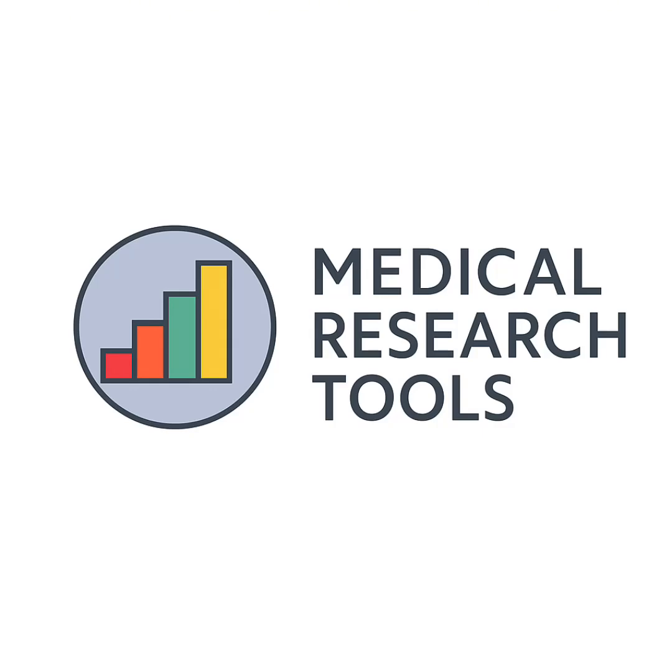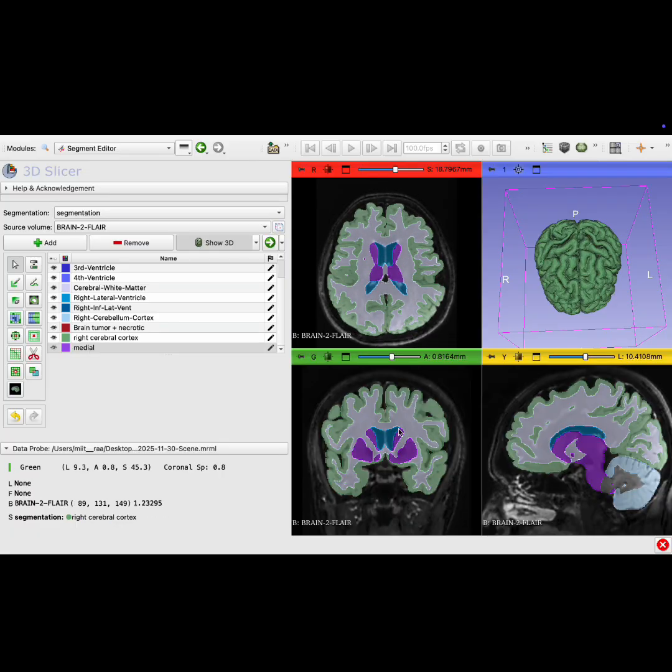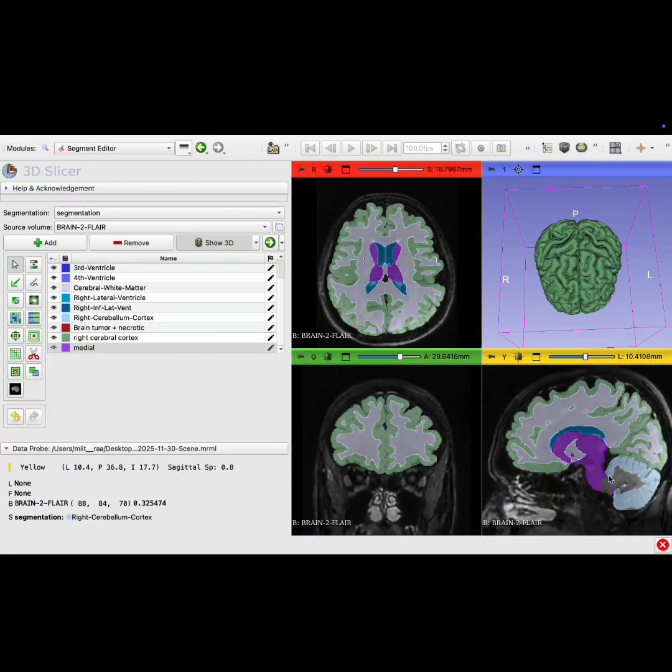In this new series of videos, I am going to show you how to use every single tool in the 3D Slicer. If you are new to this software, I suggest you follow these short videos about how to use every tool. And at the end, you're going to be able to choose the proper one for your own tasks and cases in segmentation. In this one, I'm going to show you how to use the scissors tool, one of the easiest and most useful ones in segmentation.